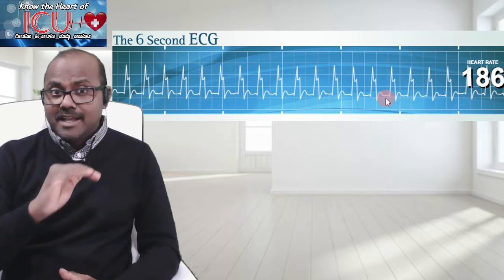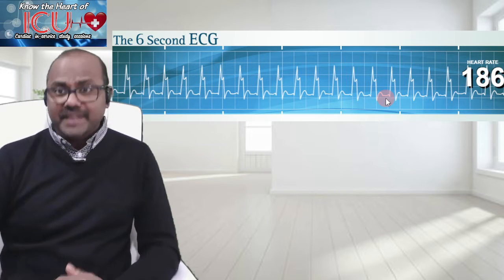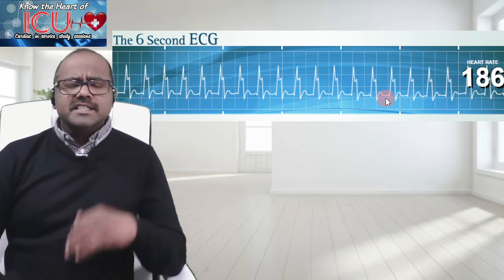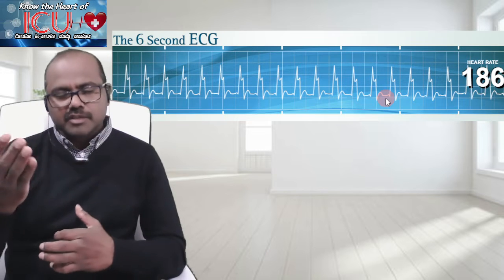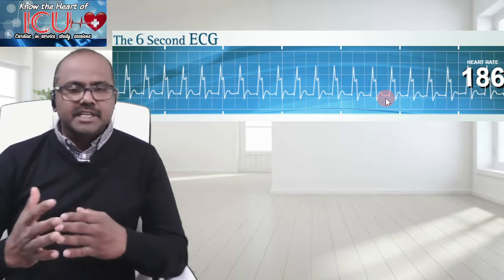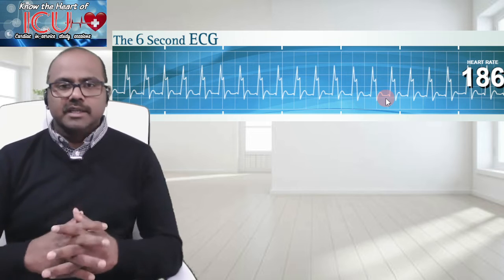It's a tachycardia. It's not a junctional rhythm, not an accelerated junctional rhythm. Instead, it is more than 100, so it's a tachycardia. And AVNRT follows the same patterns as well. The difference between junctional tachycardia and AVNRT is the physiological mechanism that caused the rhythm.